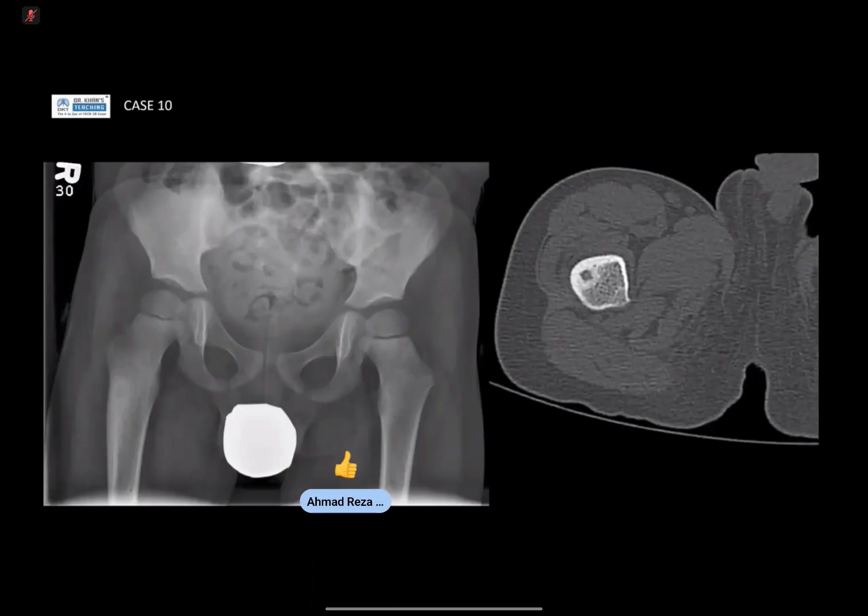And you can see how this looks very different to the non-ossifying fibroma that you described before, candidate 2, yeah? So this is a bone-forming tumour. You tend to get that really thickened cortex and that adjacent sclerosis that we're seeing nicely on the CT and the plain film here. Whereas in that non-ossifying fibroma that you described, that cortex was really thin and really well defined, and you can see how ill-defined the osteoid osteoma looks in comparison. I hope that's helpful.